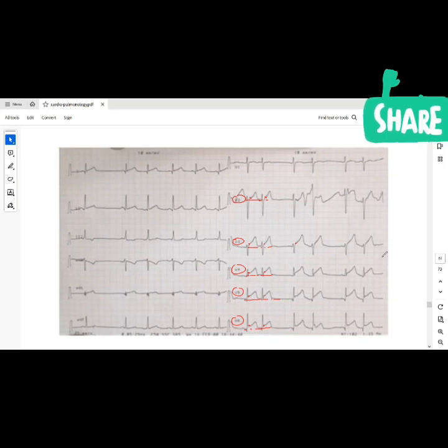Good. Tell me the location of the infarction. So V2, that could be the inferior wall. Which leads are affected here? V2, V3, V4, V5. From our previous ECG, which leads do I share with the inferior wall? Lead II, III, and aVF, correct? Yeah. So where are your V2, V3, V4, V5, V6? Where do we normally place them? They're on the chest, in the middle. So V2, V3, V4 are anterior. Where is V5 and V6? In the axilla, on the left.